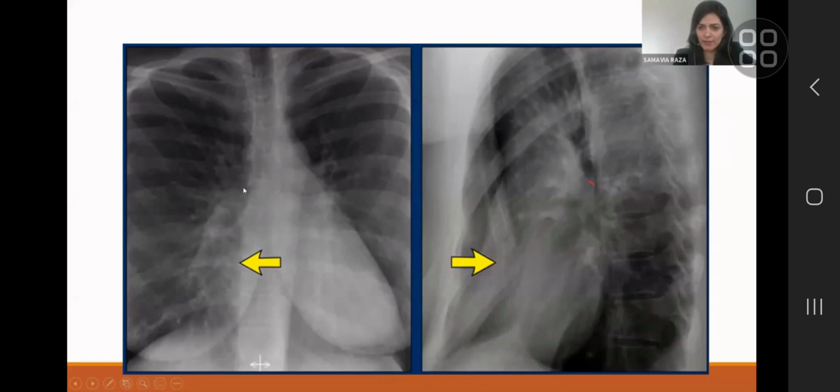But now if you see suspected hilar or mediastinal lymphadenopathy, 100% of us will go to CT. And that is absolutely the right thing to do, with the lower doses and the ease of access to CT across the world. The other thing the lateral view was conventionally done for was to assess the vertebral column in a chest. We still do lateral views, but those are almost entirely for MSK now, because you're looking at the bones and not the lung or the heart on a lateral view anymore.